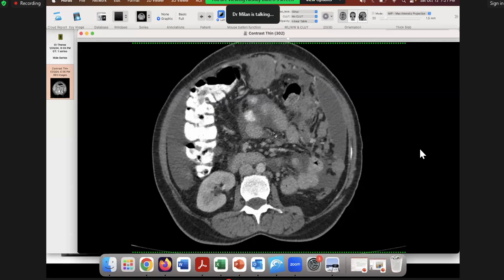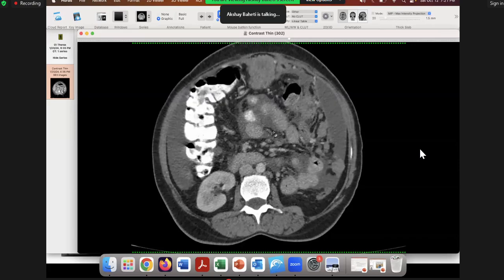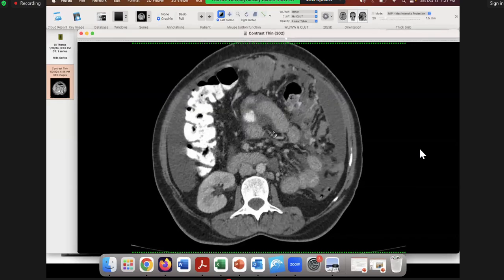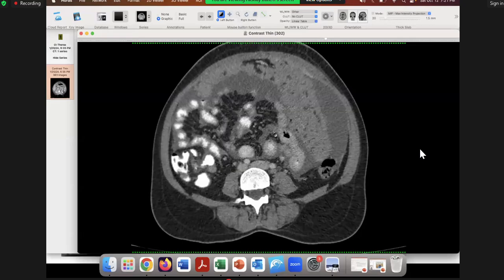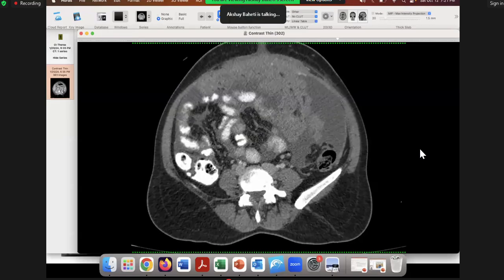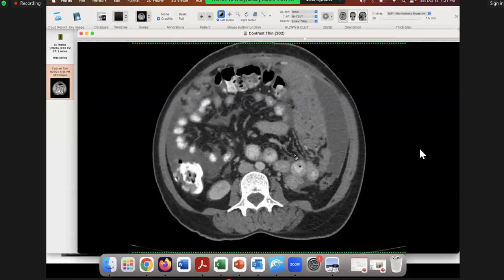The root of the mesentery extends from the DJ flexure till the right SI joint. The ileocolic junction, I mean, so that's the ileocolic junction. Yes. The IC junction, or the IC, is what you would say.